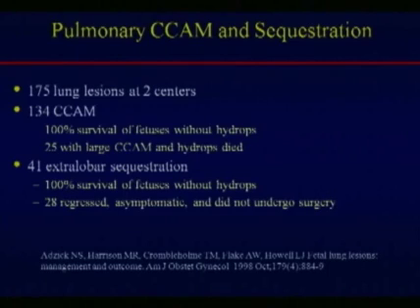So there may be different reasons why the mass effect actually looks like it resolves. But I think what happens is probably the mass itself remains stable and the lungs are able to develop and grow around it. So it becomes less prominent and less echogenic.